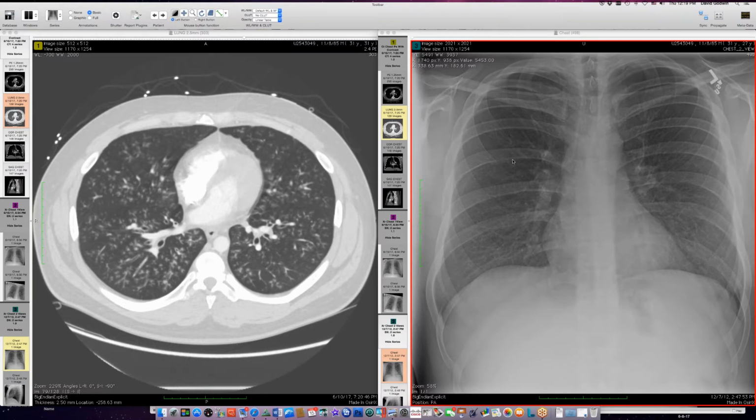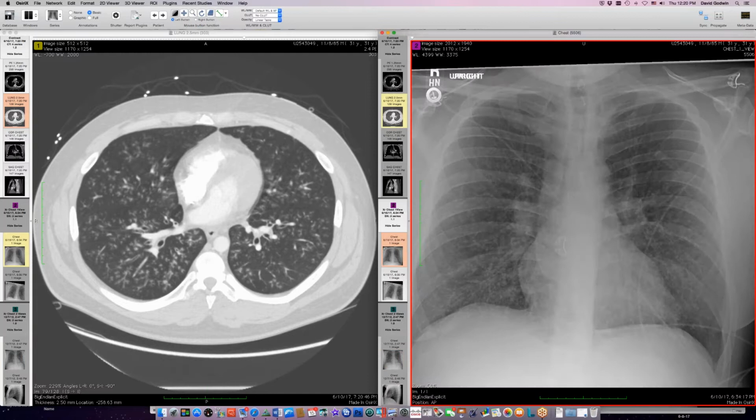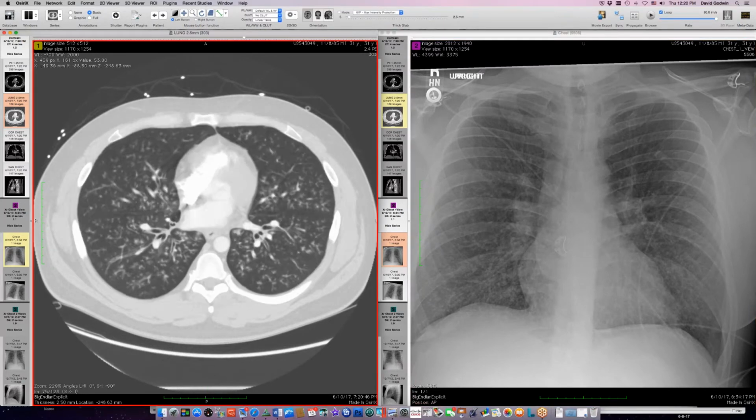So I wanted to show you this young man who came in with profound dyspnea and desaturation, and he has an interesting history. Let me start with this radiograph on your right, which is from a few years ago when his lungs were clear. On the current admission, this is what his lungs look like. There's a fine nodular pattern, seems to be mid-lung and basal predominant. And this is what his CT scan looks like.